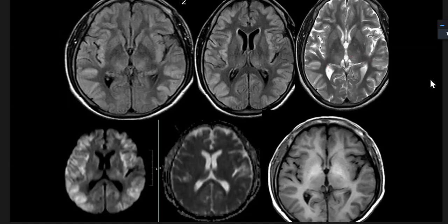So what are your differential diagnoses based on it, and what are your thoughts? Metabolic. Okay. Which metabolic condition will present as a cortical swelling with restricted diffusion? What are the most common things you would like to think? Inflammatory etiology. Do inflammatory processes involve only the cortex? Do they involve the subcortical region? Are they symmetrical? Not sure, sir. Okay, so what other things can you say? Suppose the patient had a cardiac arrest. What will you think of?